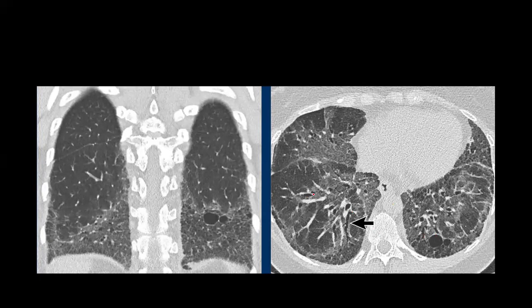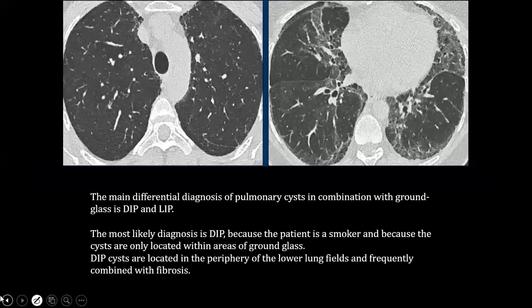This is a cyst. Bronchiectasis can be seen. So it is a case of DIP. You would be given the history of smoking. Again, this is a smoker in which you can see multiple cysts with ground glass opacities. And yeah, so this is again a case of DIP, keeping in view the history of the patient. If the cysts in a smoker are in the upper lobes and bizarre shaped, it's LCH. If the cysts are in the lower lobes with strong association of smoking and subtle fibrosis, then this is DIP, right?